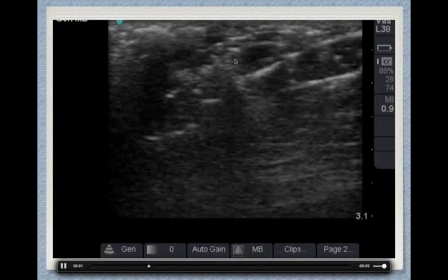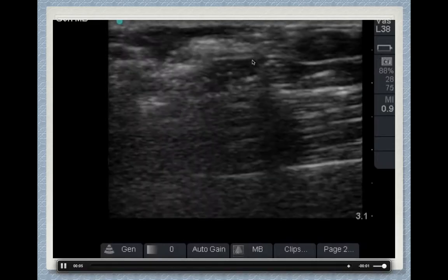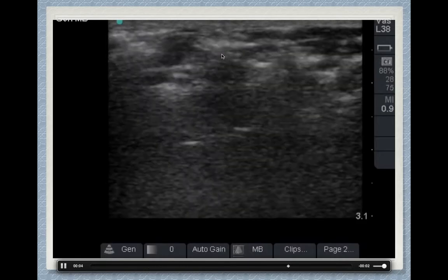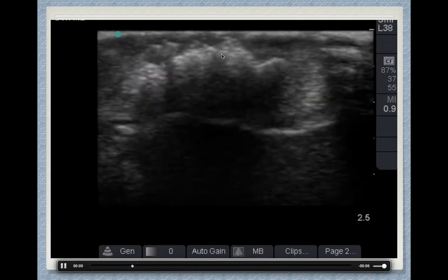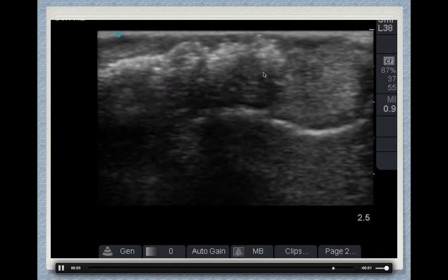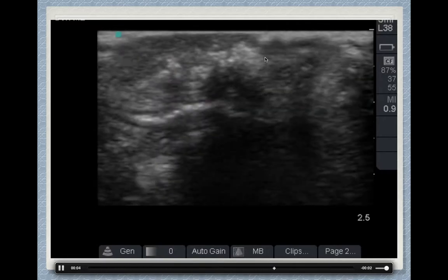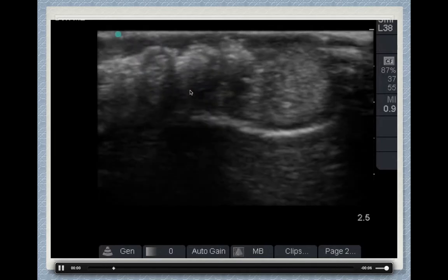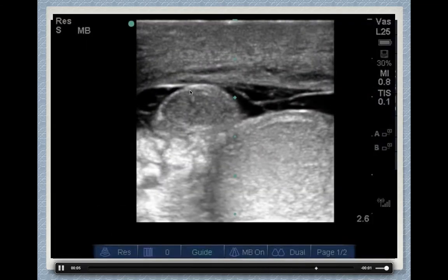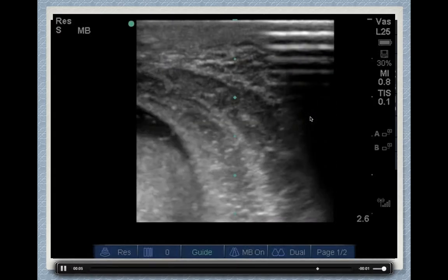This is another image showing some occasional spots where there's gas in the soft tissue as well. Again, notice these areas, hyperechoic, bright areas with nothing being transmitted behind them, suggestive of possibly a necrotizing infection. Just some subtle things to look for when you're doing these exams, some things that can add to your clinical suspicion. What do you guys think this is?